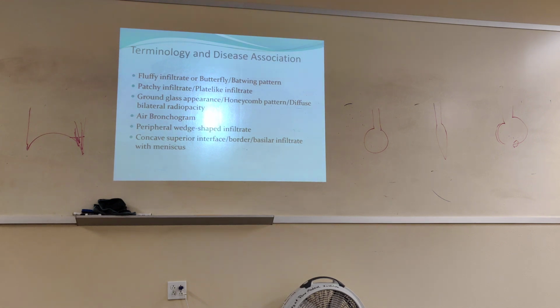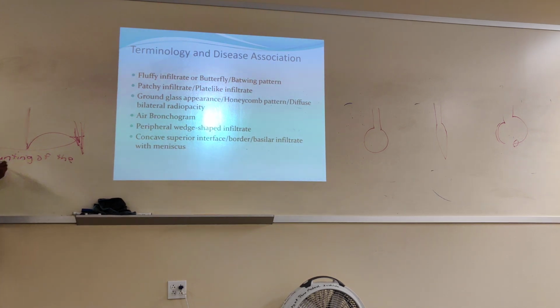So that's what they're saying. There's two more names for it. They can say blunting of the costophrenic angle.